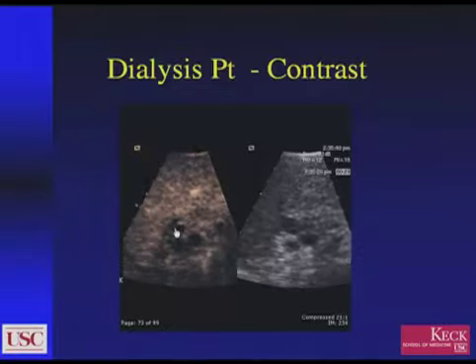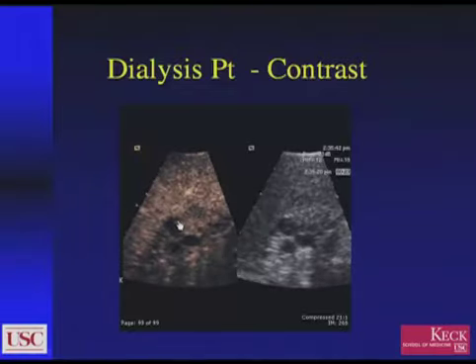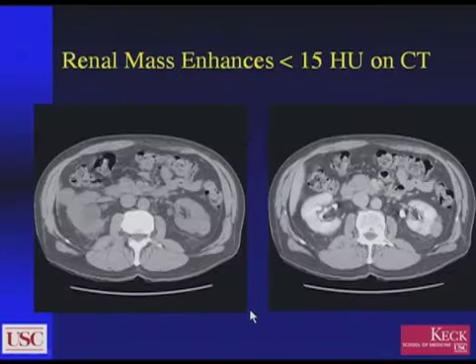These patients do have a propensity to develop renal cell carcinomas. And on the ultrasound, you can see here that there is maybe a septum in here, but this is largely an avascular area. You can see the grayscale appearance of this here, and this represented a hematoma within a small cyst in this dialysis kidney.